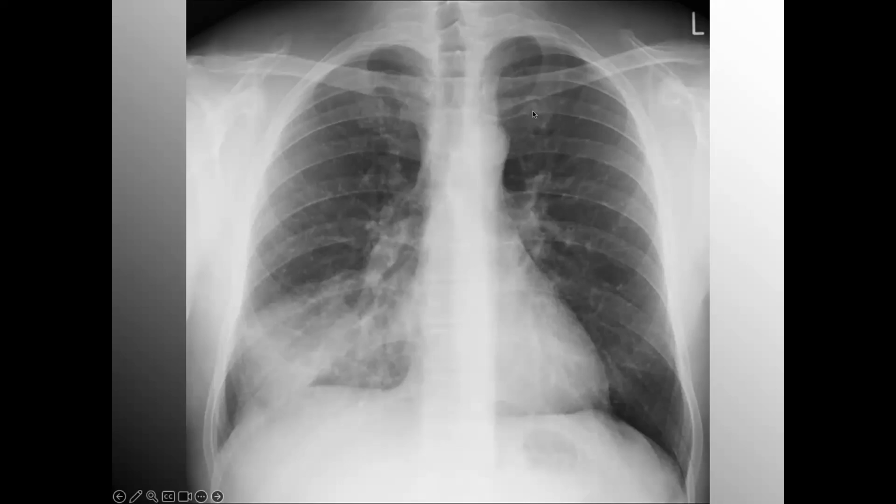For C, cardiac, I can see my left anterior border quite well. My right is completely gone. So what does this tell you? If I was in a room full of people, I would love somebody to shout it out to me, but I'll watch the chat as well. This tells me that I most likely have a right middle lobe infiltrate. And in this case, it's just good old-fashioned pneumonia.